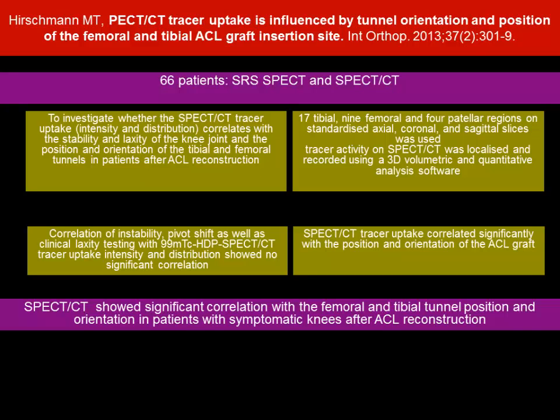Unless we get information about the type of prostheses or type of surgery, it is very difficult to interpret accurately. So all we need is good information from the orthopedic surgeon, and we have to understand the dynamics of hip or knee replacement. If you don't understand that, and we are just going on a principle of mathematics that increased vascularity, increased uptake, likely infection, or normal blood pool, abnormal uptake, more likely loosening.